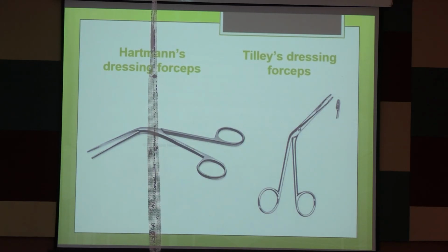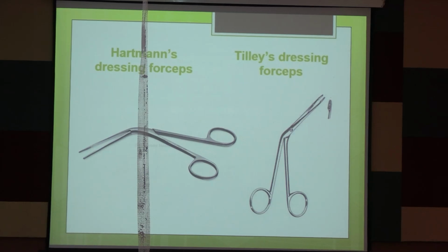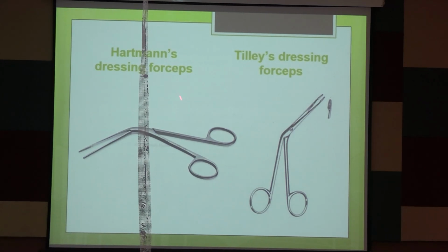Next, this is a very, very important instrument. Even in OPD we use it frequently. This is a specially built forceps. This one is Hartmann forceps. Sorry, this one is Hartmann forceps, and this one is Tilly's forceps. Right?